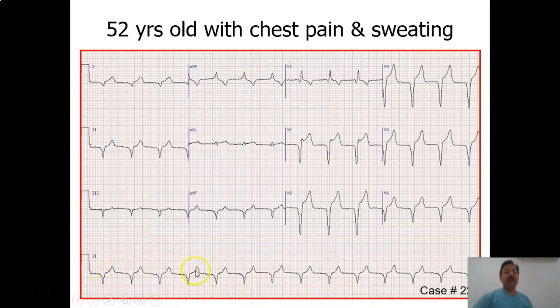This is a regular ECG, but no P wave. The QRS complexes are wide, and it's regular. So wide regular QRS complexes at a rate less than 100. So it looks like accelerated idioventricular rhythm. Axis, right axis deviation. Hypertrophy, in wide QRS complexes, better not to comment on hypertrophy. Bundle branch block, this may be a right bundle branch block here.